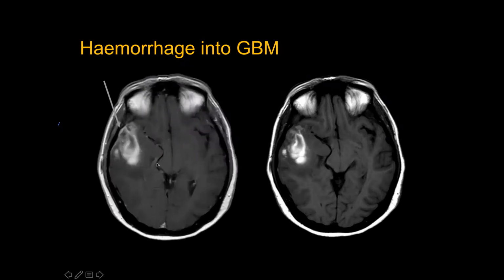Post-contrast, you see this bit here, it's all enhancing. These are the enhancing solid components. So never ever ever look at a post-contrast T1 without pre-contrast, because without a pre-contrast, you do not know what is enhancing. Okay, these are the areas of enhancement. This is all due to blood products.